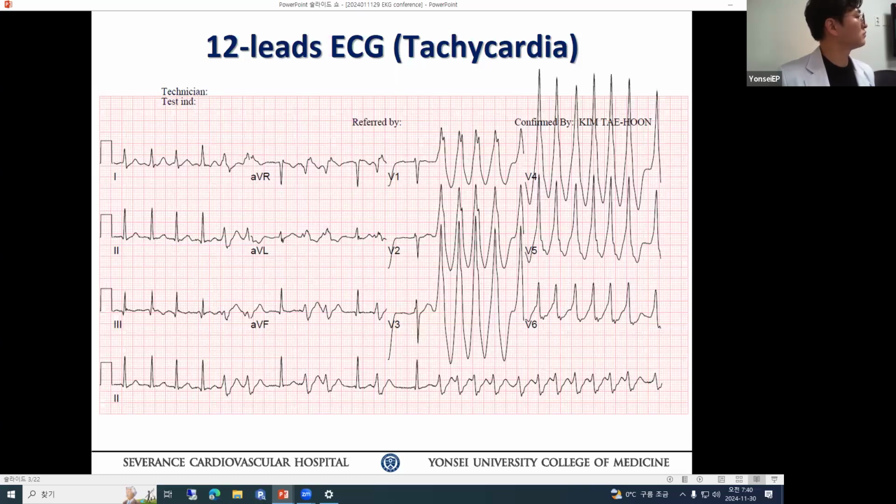And in presence of that, patient has different degree of QRS duration as well. Look carefully. QRS duration is not the same. They're changing. If this is aberrancy, you can have right or left bundle aberrancy. Only other degree of QRS change would be a bundle branch block aberrancy to the complete block. So it's not there.